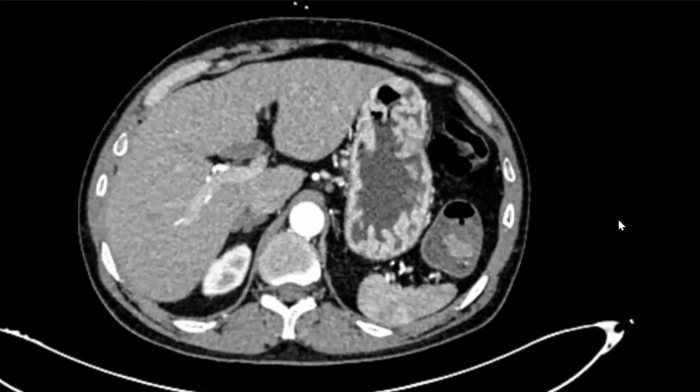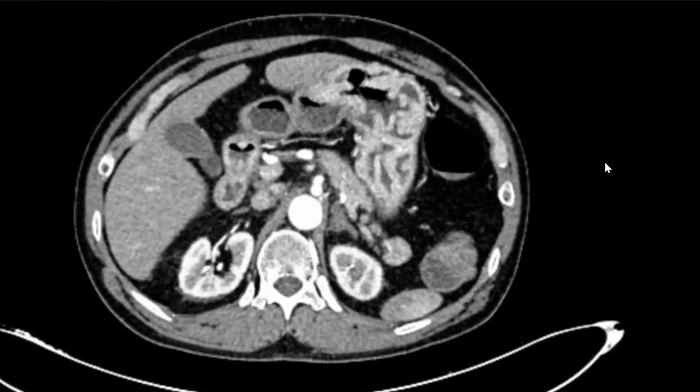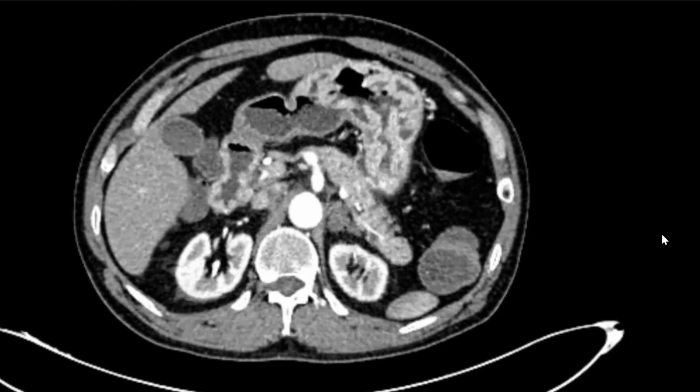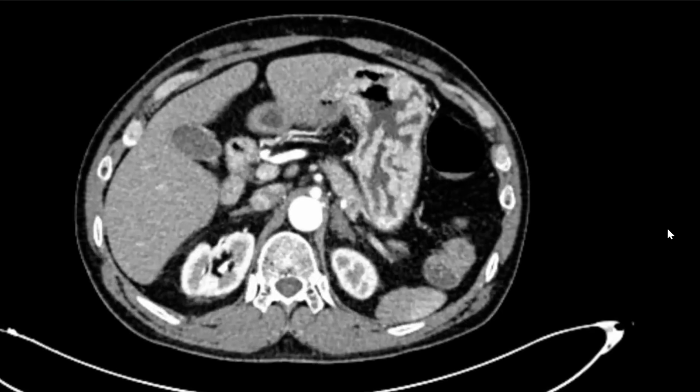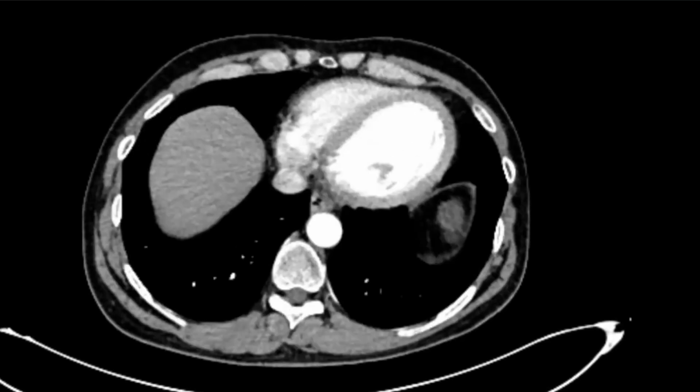I would also advise H. pylori testing. If I tell you that the patient has had multiple episodes of gastritis and gastroesophageal reflux, you would also like to look at the images in the coronal scan to look for any evidence of hiatus hernia.